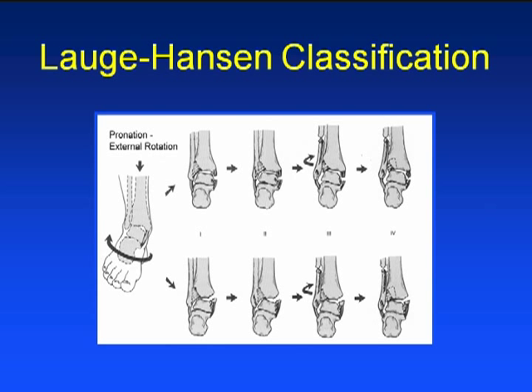You extend the tear into the syndesmosis, and you crack high. It's a Weber C fracture. And then the last thing that can happen is the lateral talar dome can roll all the way around and push off the posterior malleolus. And so this ends up being a trimalleolar fracture as well, a Weber C fracture, or a pronation external rotation stage 4 injury.